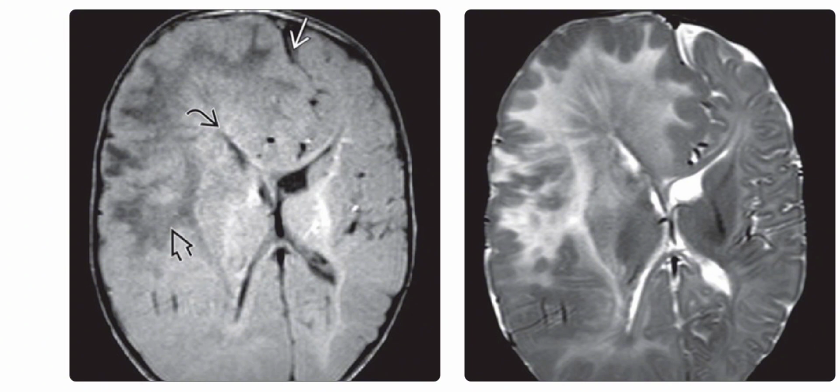The right image is the T2 weighted MRI in the same patient, and it shows that the white matter is expanded and hyperintense compared to the normal left side. The overlying cortex appears dysplastic and the gray-white matter junction is indistinct.